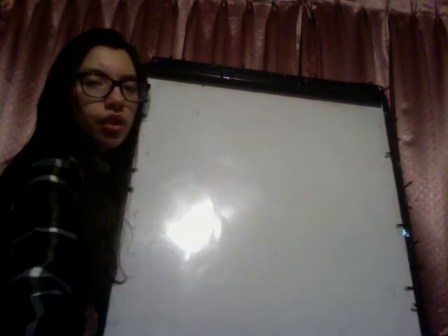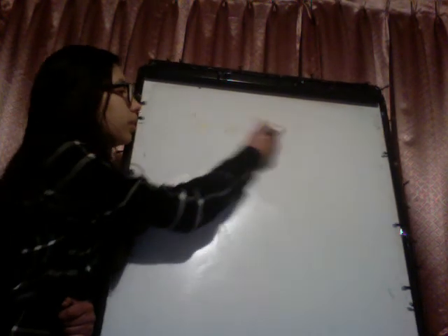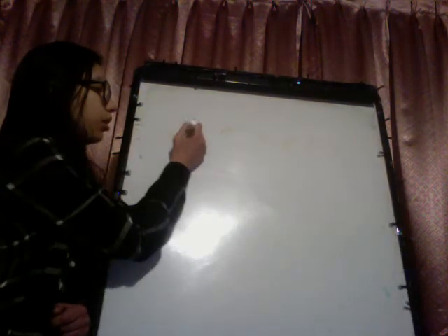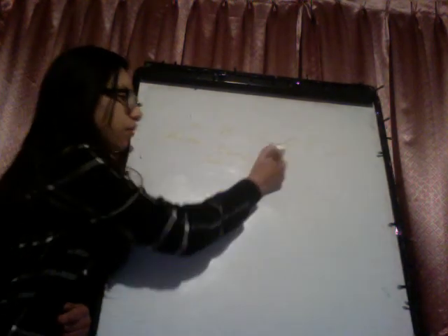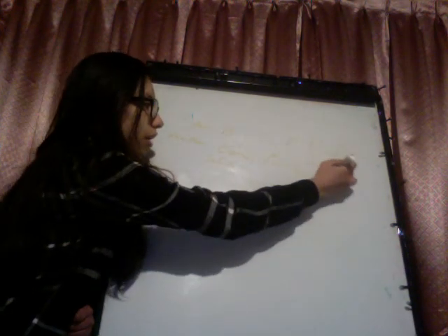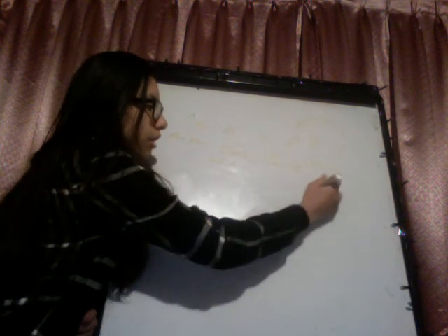We are going to see the algorithm of how to interpret a chest X-ray. We have A, B, C, D, E, F. A of airway, B of bones and soft tissue, C of cardiac silhouette, D of diaphragm, E of effusion, and F of fracture.